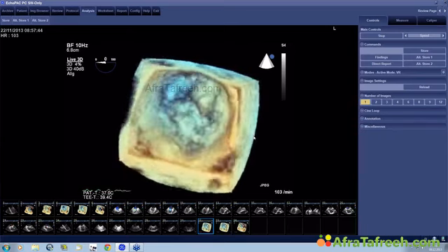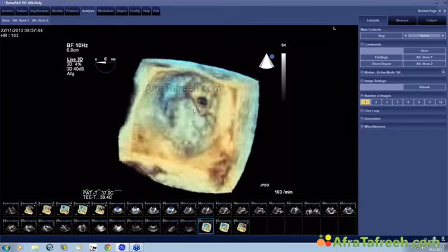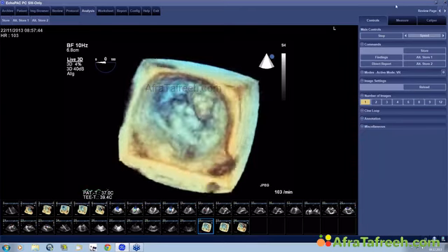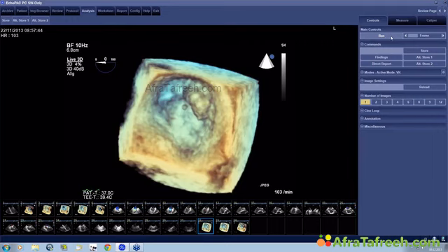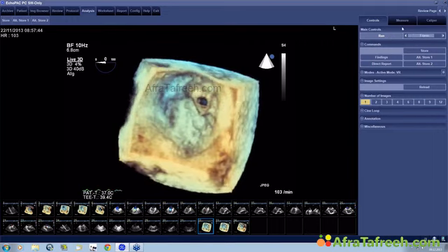But let's go back to the pathology. So if we look at this 3D image, what we see here is a part of the posterior leaflet which prolapses, right? And then you've got a hole in here. I'll stop the image here, 1 second. Okay, I'll just go back and forth. See, you see this hole here?